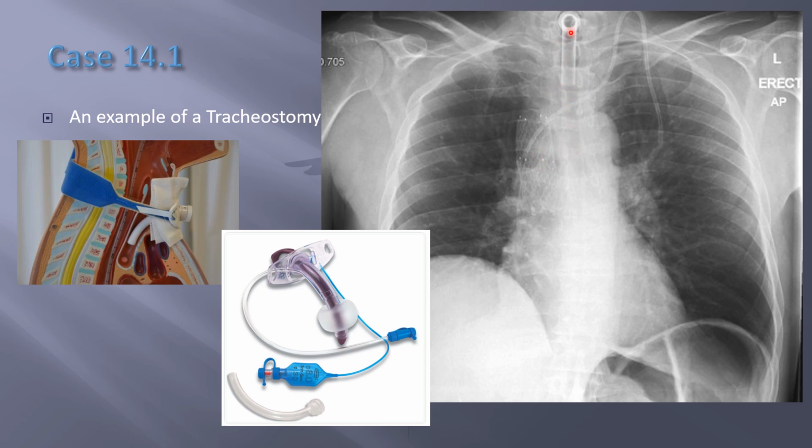So this is a picture of what it looks like to be trached. So here's the flange here. You can kind of see the flange here. This patient also has a port, some sort of metaport, and it looks like some sort of vascular repair or stenting of some sort here. All right.